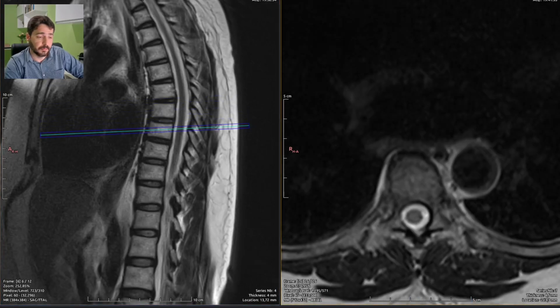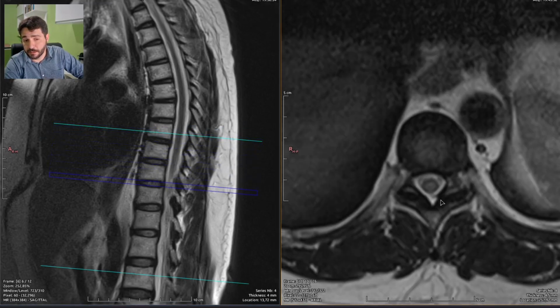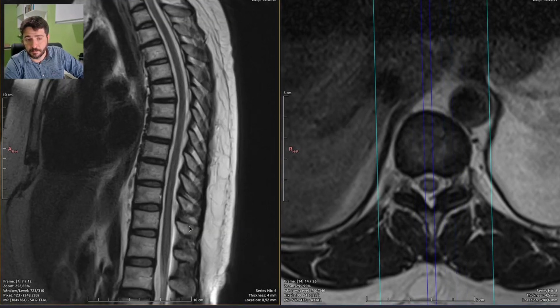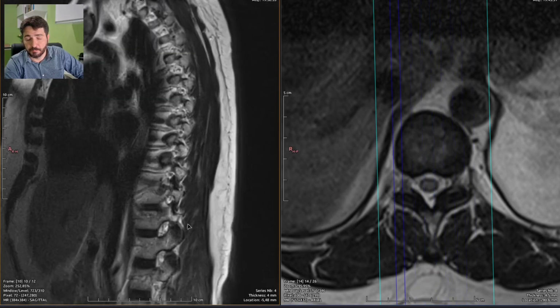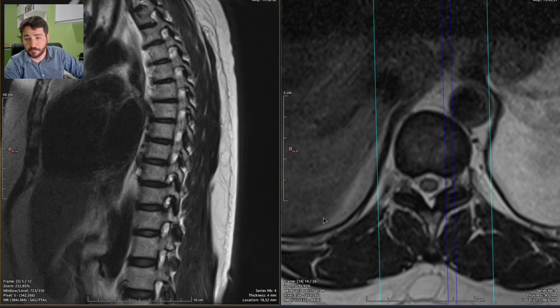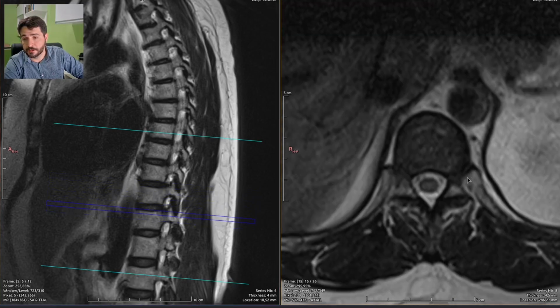Don't worry, I have to say which segment is that because I'm going to report that. So I don't know, is this bulging? I don't know, might be just me wanting to report it, so I'm going to leave it aside. There is really arthrosis here, so there is mild arthrosis.